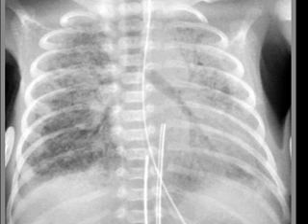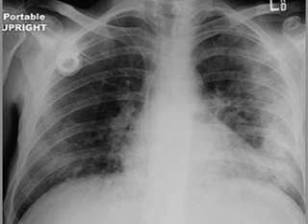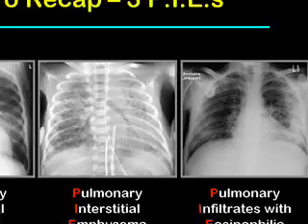There are small bubbles of air that are seen throughout the lungs. And pulmonary infiltrates with eosinophilia. There can be multiple causes, as we've seen. The airspace opacities with pulmonary infiltrates with eosinophilia tend to be fleeting or transitory. They may be the reverse of pulmonary edema and laterally placed in the lung.